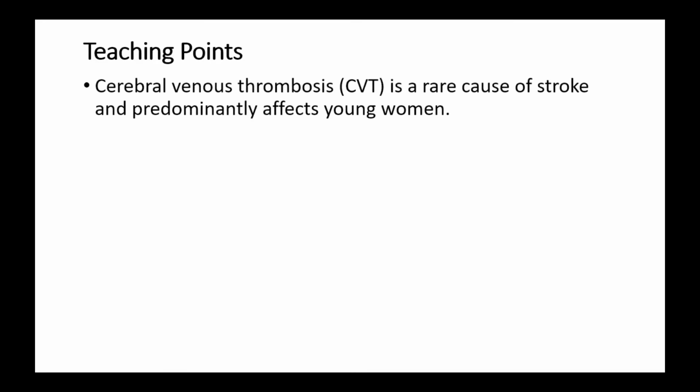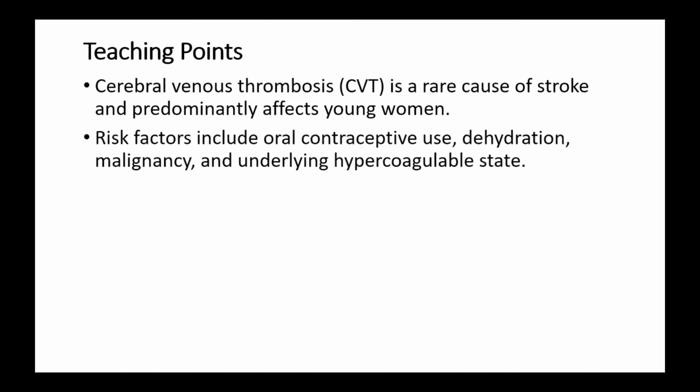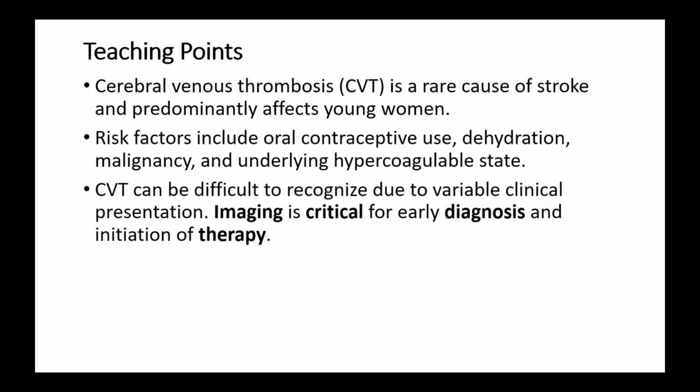Some teaching points on cerebral venous thrombosis. It's a rare cause of stroke and predominantly affects young women. There are some risk factors including oral contraceptives, dehydration, malignancy, or some hypercoagulable states. It may be difficult to recognize due to its variability in clinical presentations, and therefore imaging is critical for early diagnosis and consequently initiation of therapy.